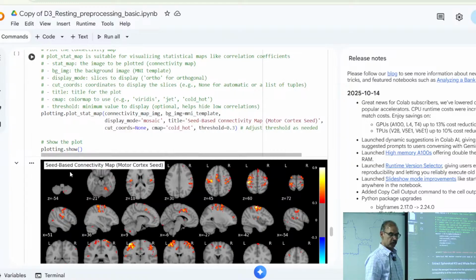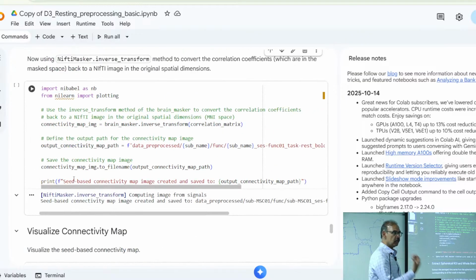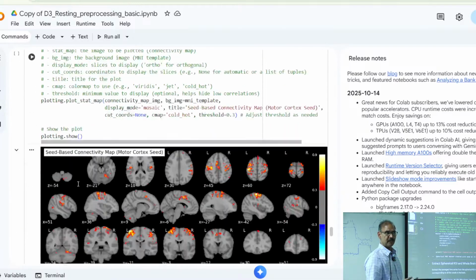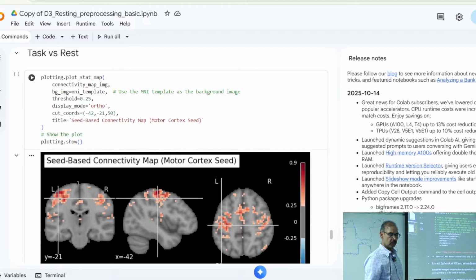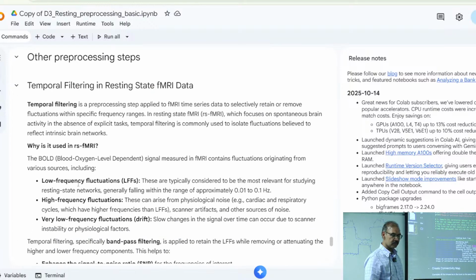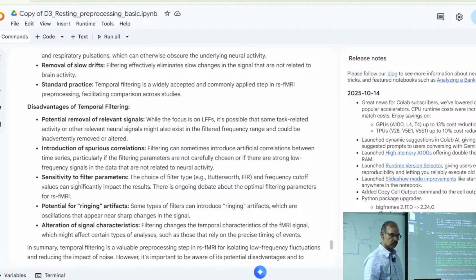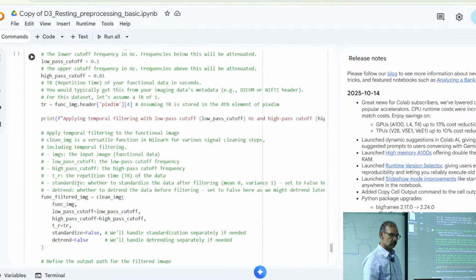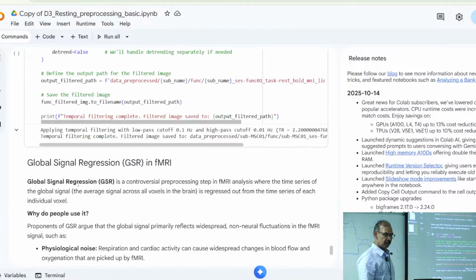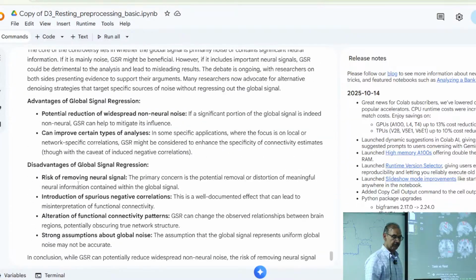So what would happen if you took plus 38, minus 22, 60, used it as a seed and then did the same analysis? What would you get? So try that. And if you do that, you can keep the other values the same and then look through that.